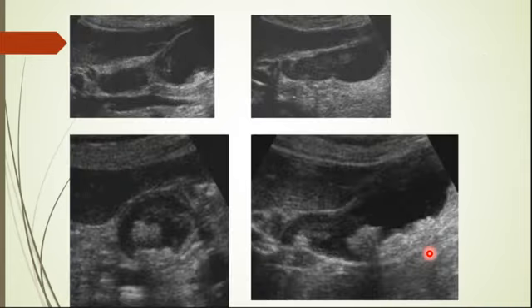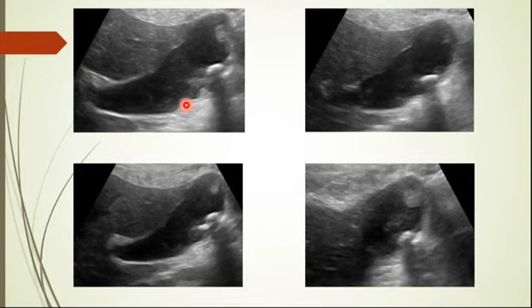You can have both. For example, you can see here an abnormal gallbladder. It was interpreted as cholelithiasis or gallstones and cholecystitis with sludge. Operation done, it was gallbladder carcinoma. You can see the stone here, thick wall, edematous, some pericholecystic edema. Everything looks like cholecystitis. Surgery done, it was gallbladder carcinoma. It's not that easy to differentiate. Again, a gallbladder with stones and soft tissue structures that were interpreted as polyps. You can see the stone here and some soft tissue, something here. At operation, it was gallbladder carcinoma.